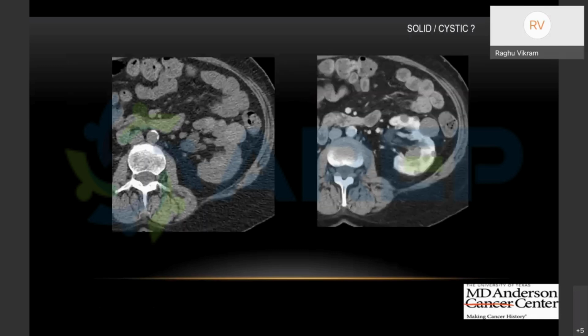So for example, this is an example here, of CT scans. A non-contrast or a pre-contrast CT scan and a contrast-enhanced CT scan, and you have these multiple renal lesions, particularly this one, which is a partially exophytic lesion here. The question is, is it enhancing? And of course, you'll do a ROI measurement, and the difference is about 13 Hounsfield units. So there is pseudo enhancement. Let's not go into pseudo enhancement. You know about pseudo enhancement, I'm sure. You can get an enhancement of up to 10 Hounsfield units, and between 10 and 20 is when you start thinking, that's the gray area that could be pseudo enhancement.